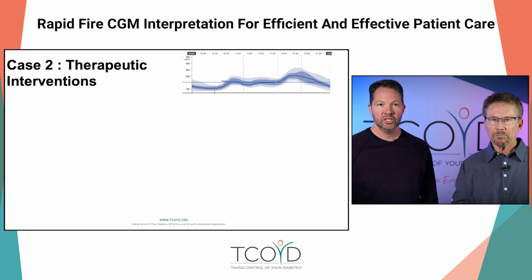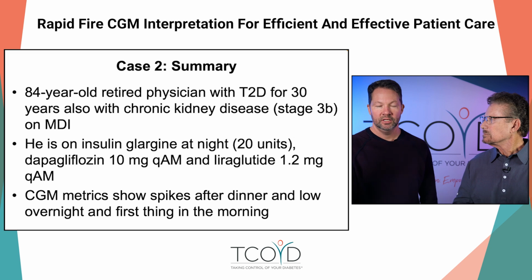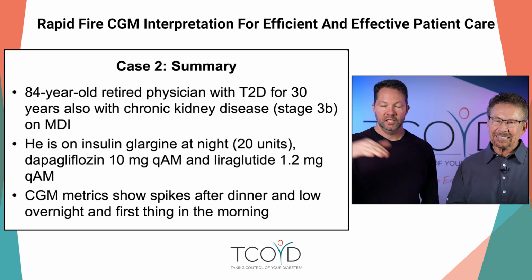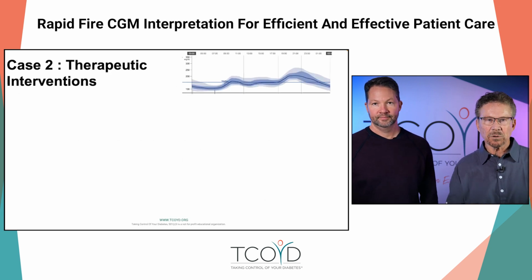So, and that's so important because, if you just saw that A1C, a lot of providers would say, okay, just some more Lantus, because that's what I can go up on. That's the last thing this guy needs. He needs less Lantus and something else to address these nighttime spikes. Yeah, and I put the tracing up on the subsequent slides to remind people.